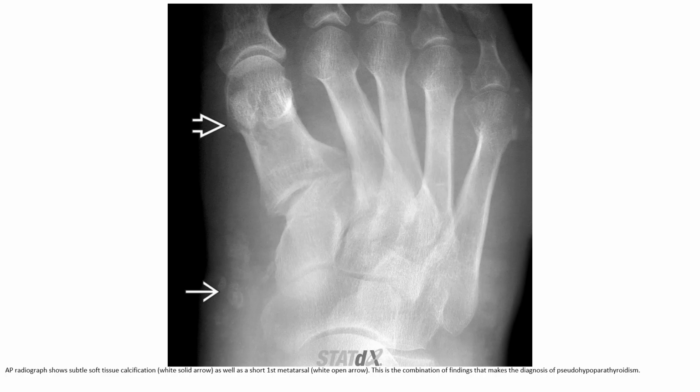AP radiograph shows subtle soft tissue calcification as well as a short first metatarsal. The combination of findings makes the diagnosis of pseudohypoparathyroidism.